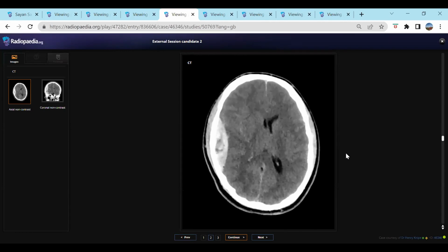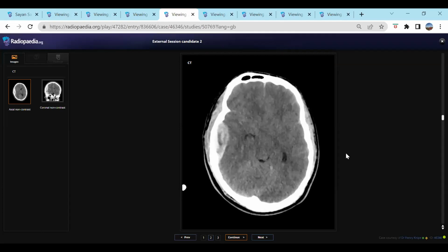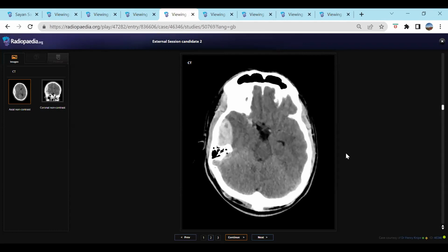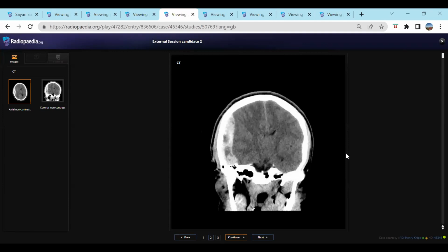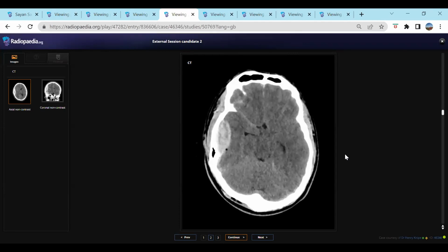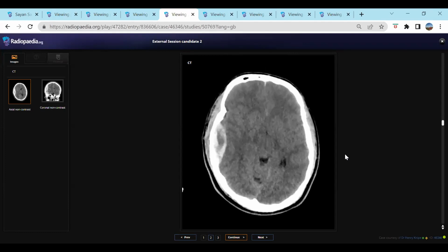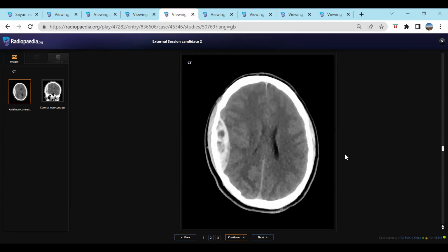And there's mild contralateral midline shift. There is effacement of the underlying sulci. There is also suggestion of possible impending uncal herniation. So in my normal clinical practice, I would pick up the phone and urgently inform the neurosurgical team on call, as this patient has subfalcine herniation and impending right-sided uncal herniation, and this epidural hematoma needs to be urgently evacuated.